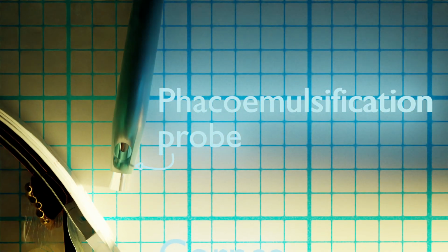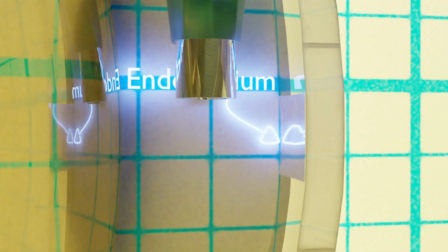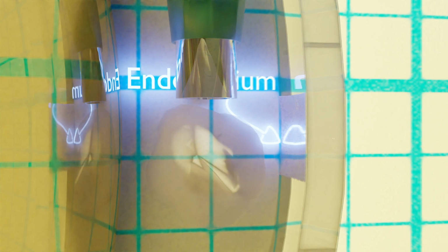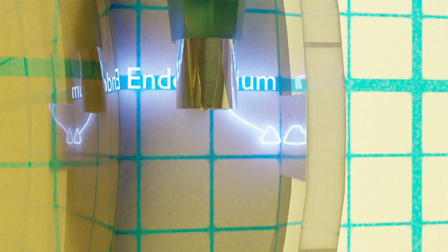Firstly, cataract surgery. During cataract surgery, we use a phacoemulsification probe and pass this into the front chamber of the eye. We use this to break up and remove fragments of lens. The turbulence in the fluid of the front of the eye involved in this process will inevitably lead to stress to the endothelium. And there is always accelerated loss of cells because of this. If the cataract is particularly hard, or if there are factors that make the surgery more difficult, there can be particularly high loss of cells.